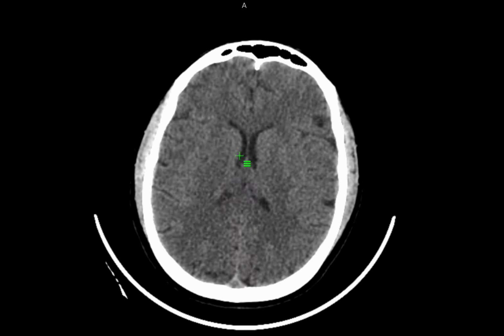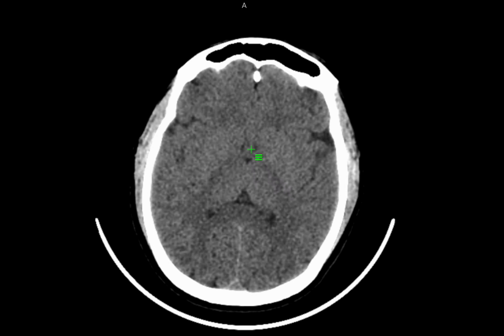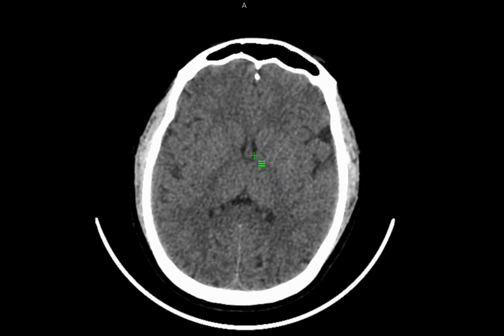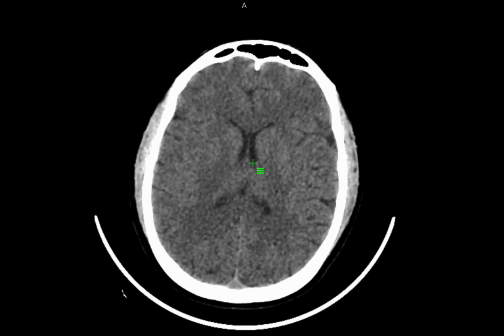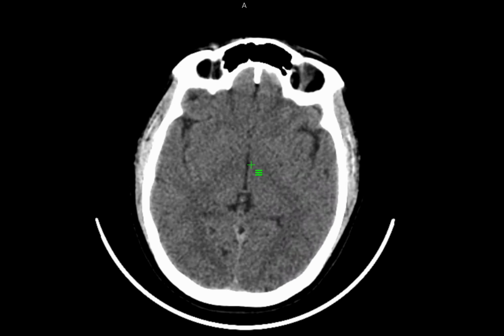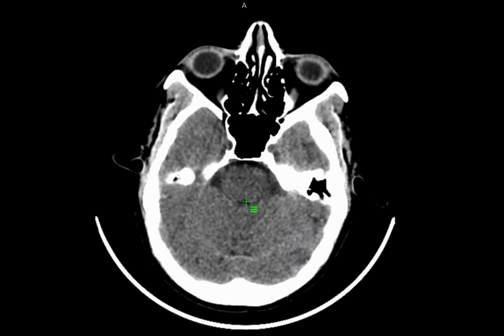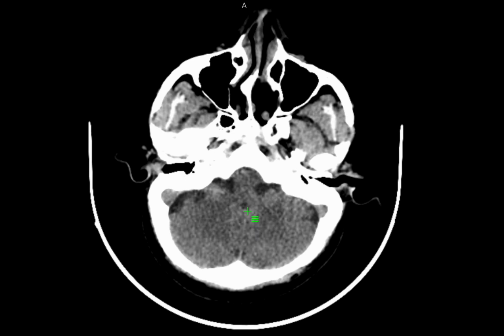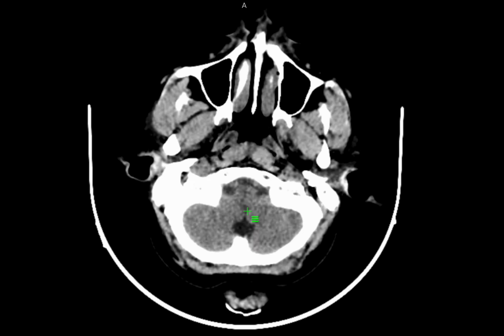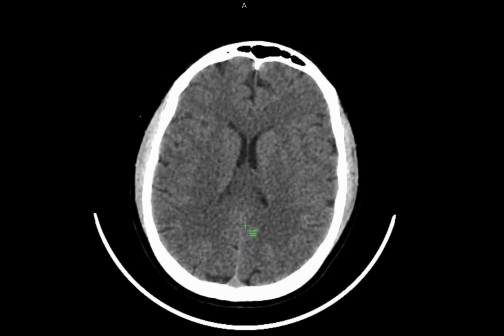So another part is the ventricles. So here when you see, these two are the lateral ventricles, and then once you come down, here will be the foramen of Monro, this opening over here, both sides, and they will open into the third ventricle. This is the third ventricle over here, and the third ventricle will further form the aqueduct, and aqueduct will further open into the fourth ventricle, and the fourth ventricle will go down and open into foramen of Magendie and foramen of Luschka, and this is the cisterna magnum. So this is the ventricular anatomy.